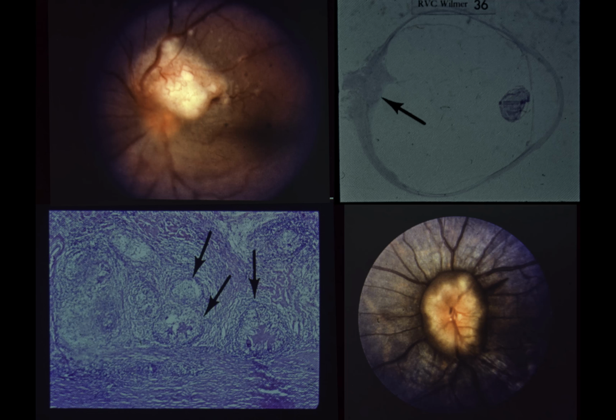Upper left. A fluffy white lesion is seen above the left optic disc. Retinal vessels are dilated over this lesion, and vitreous opacity partially obscures the disc. With a history of biopsy-proven sarcoidosis from a cervical lymph node 6 months earlier, the presumed diagnosis was a peripapillary choroidal granuloma secondary to sarcoidosis. The patient was treated with systemic steroids, and visual acuity improved to 20/100ths within 2 weeks and continued to improve subsequently.